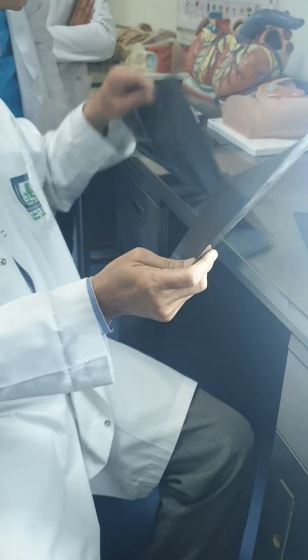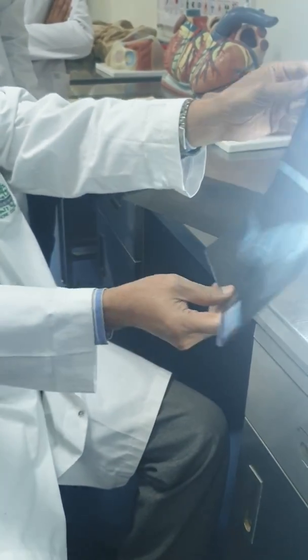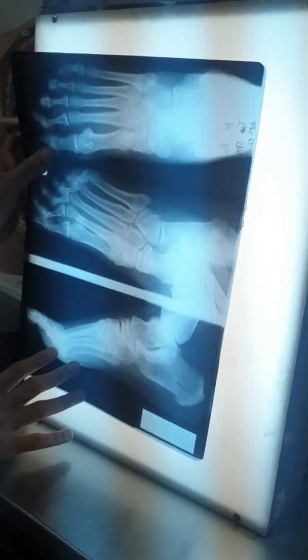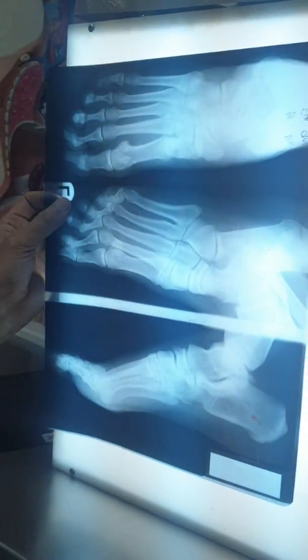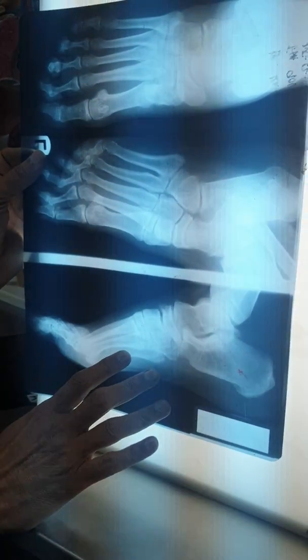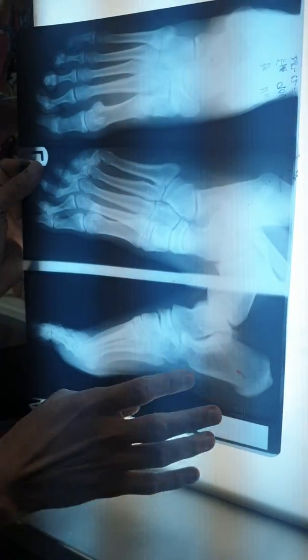This is the lateral view of the foot. This is again very important. You have to identify at least the bones here. We haven't taken the foot yet, no problem. Just identify the bones slowly. I will tell you, and you can repeat it again. Maybe you see these bones here, the bones of the foot you have not done. I'll just show you, you can see it later.